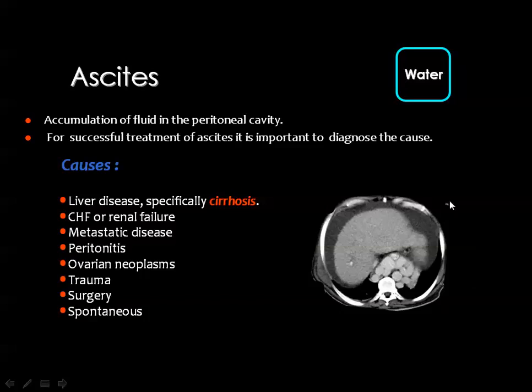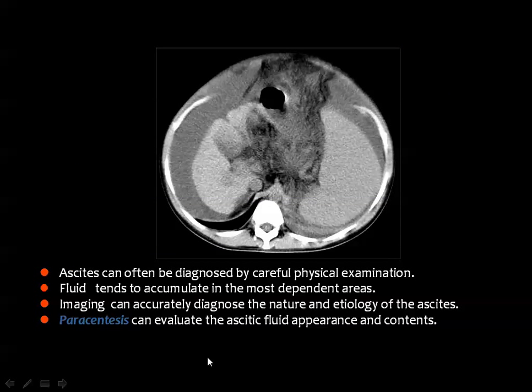And this CT image obtained after contrast injection showed extensive esophageal varices, dilated tortuous collateral venous channels at the region of the gastroesophageal junction. The liver is cirrhotic and there is a good amount of ascites in the peritoneal cavity. Then this is a case of liver cirrhosis, splenomegaly, and ascites within the peritoneal cavity.